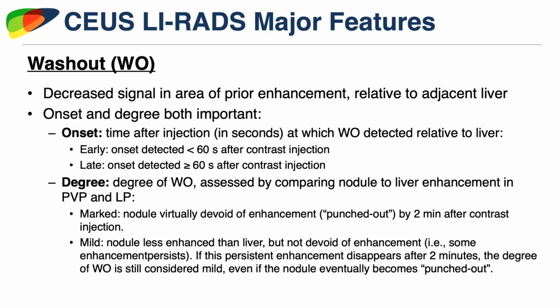So marked is considered almost devoid of enhancement, almost appearing punched out in appearance within 2 minutes after injection. We do know that some HCCs will have this appearance later, say 3 or 4 minutes, but that shouldn't dissuade you. We consider the complete punched out appearance as marked washout if it occurs in less than 2 minutes. Mild is, of course, any degree of enhancement that is not marked at any time point after injection.